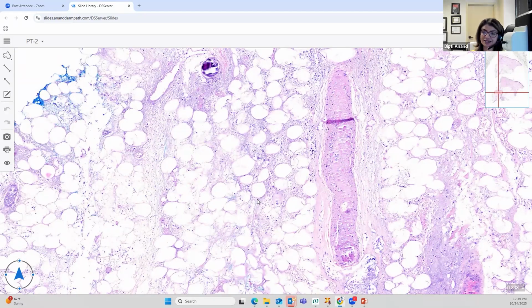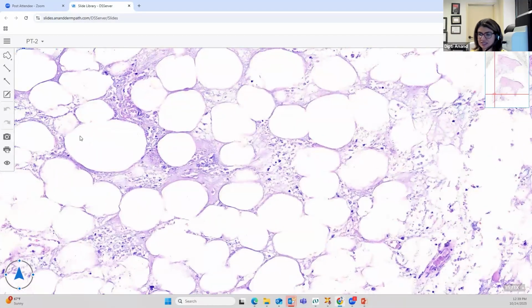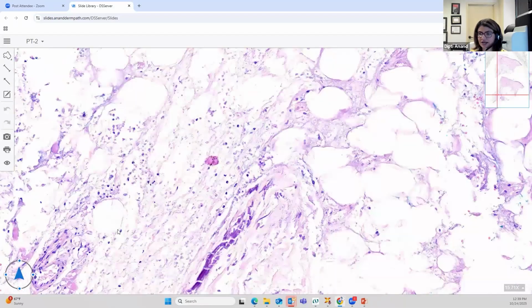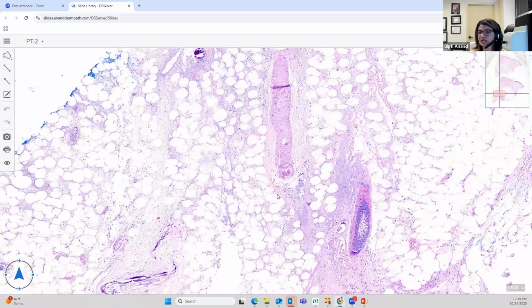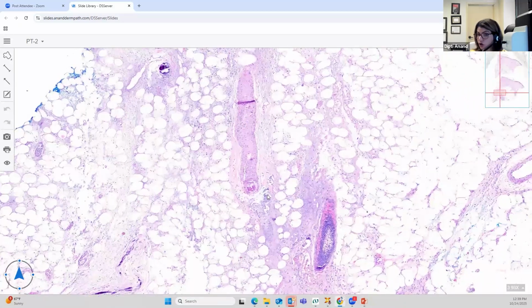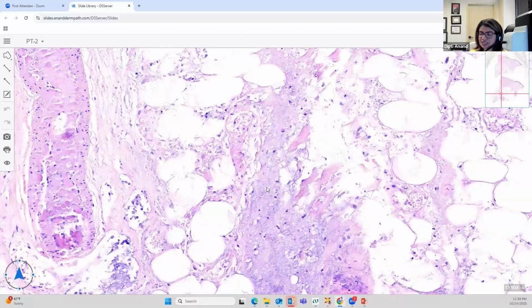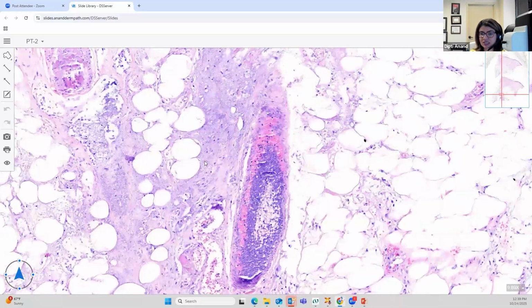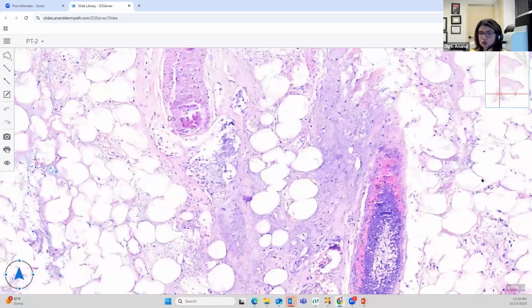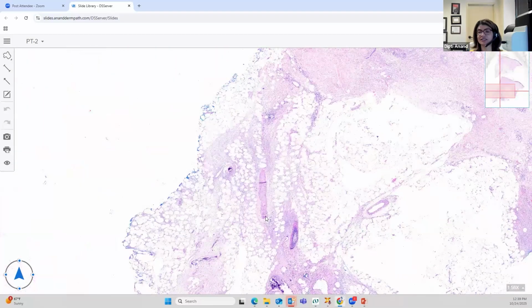But when you see dead fat which is variably sized and spaced with dirtiness involving it, like what you see in here, there are neutrophils and there is debris, there is leukocytoclasia and dust, that's indicative of active vessel destruction like what you see in calciphylaxis, or because of an infection like what you would see in erythema induratum. So this is the classic pattern of very dirty ischemic fat necrosis: variably sized fat, dead fat with all this tissue basophilia and necrosis. This is what you want to see in calciphylaxis.